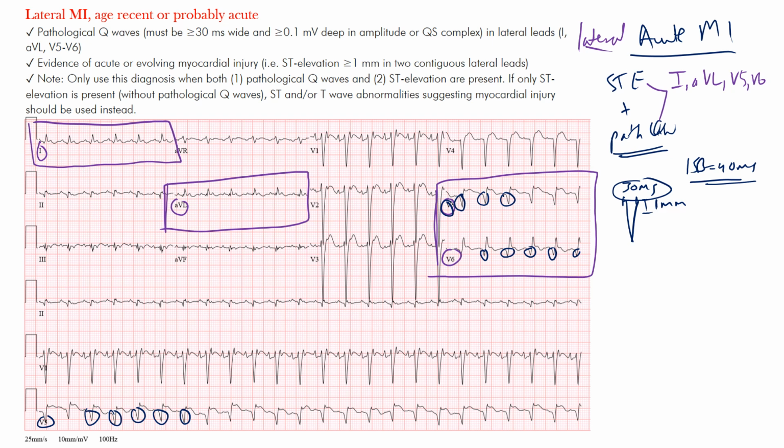And now the ST segment should also be deviated. So notice here the ST segment is above baseline. You have that morphology that is consistent with an injury pattern, even elevated here in V6 as well. It's a little hard to see here in AVL. You can barely see any Q waves, but there's some notching there, and notching is something that you should be aware of and may actually represent a poor ventricle or some scarring that may have taken place.